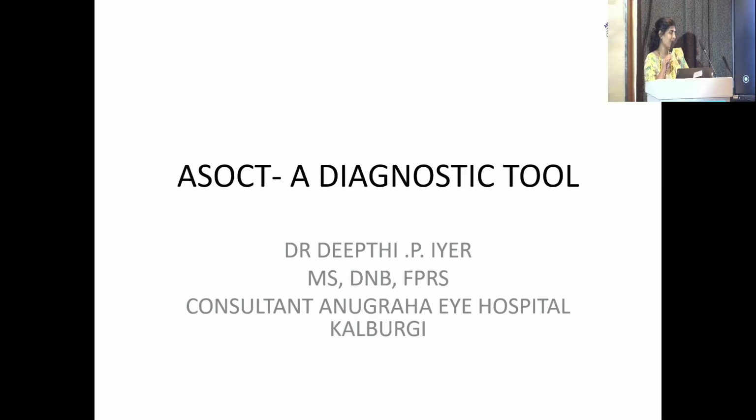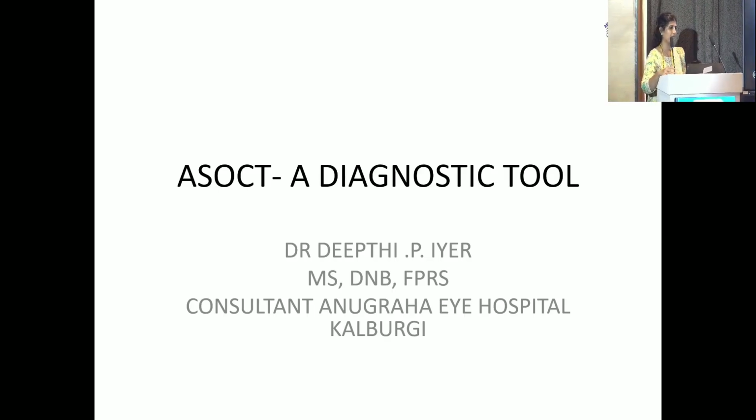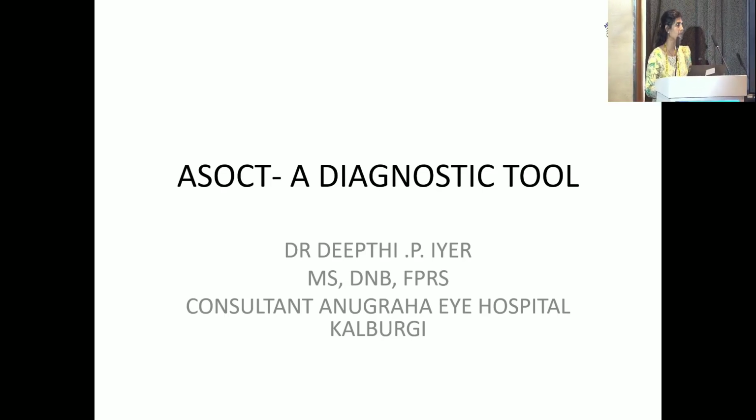So, good evening all. I'm speaking about anterior segment OCT, how it can be used as a third eye to diagnose corneal disorders as a comprehensive ophthalmologist, and how we can use it in our daily OPD. I would just go through a few case examples so that we can know how it aids.